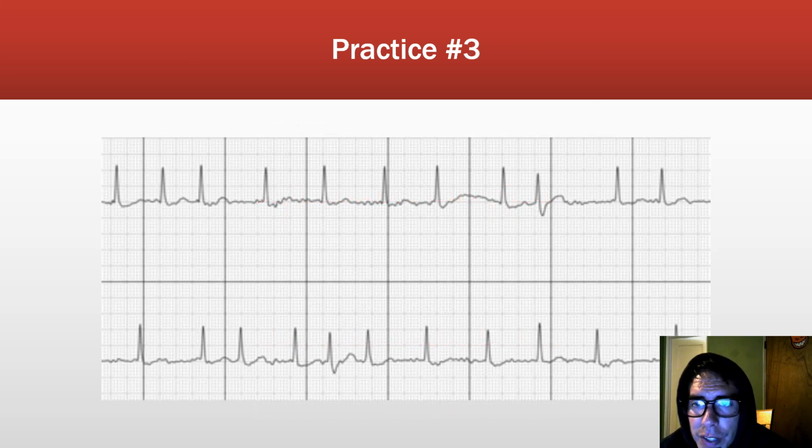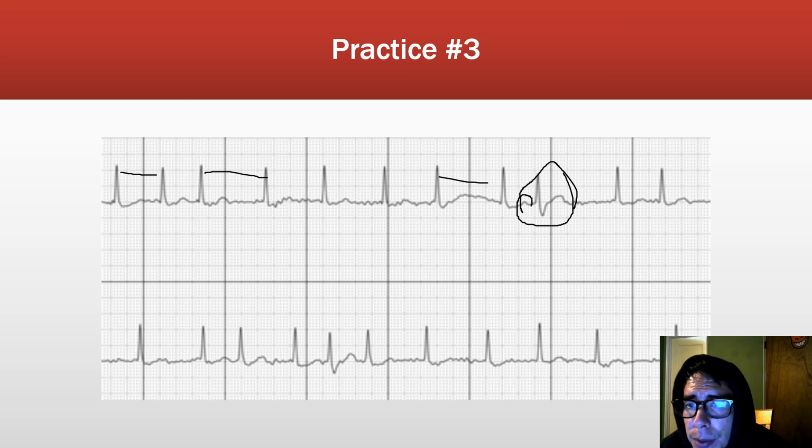So this one is very irregular. The distance between here and then like there is big. There, that right there actually is an ectopic beat, I think. And the reason for that is because there actually is a P wave, which with the way everything else is here, I wouldn't expect that. And you'll learn that when we talk about atrial rhythms, but it's irregular. Besides that ectopic beat, we have no discernible P waves, and our QRS is within normal range.